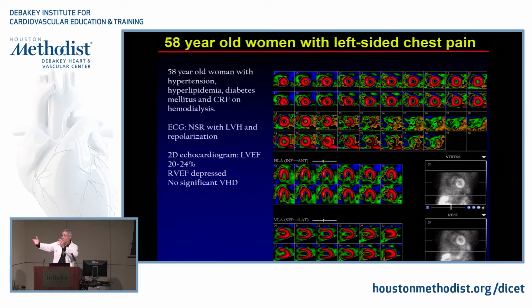Dr. Solomon, you're here. You've done CT and nuclear, so what do you think about these images? This is stress, and this is rest. From here, I don't see any significant defect. Okay, so it doesn't look like there are any significant perfusion abnormalities. There may be an element of RV. There may be a little bit of reduction inferiorly again. You have to wonder whether that could also be some diaphragmatic attenuation.